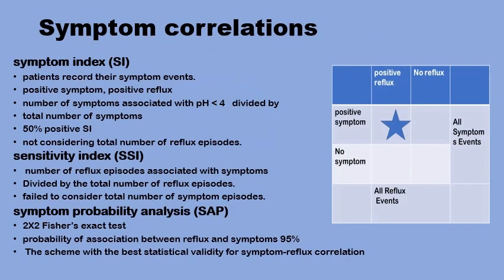Now, how does this monitoring of the pH and the impedance over a 24 hours period correlate with what the patient actually feels, his own symptoms?